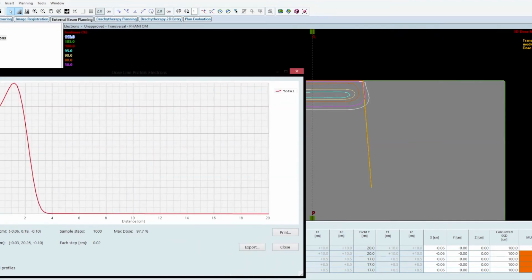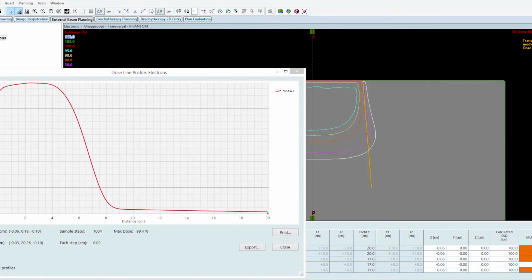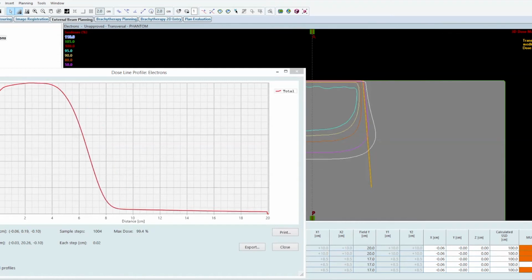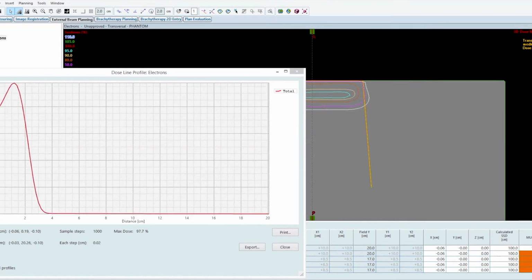Okay, so you have 6E, 9E, 12E, 16E, 20E, 16, 12, 9, and 6.